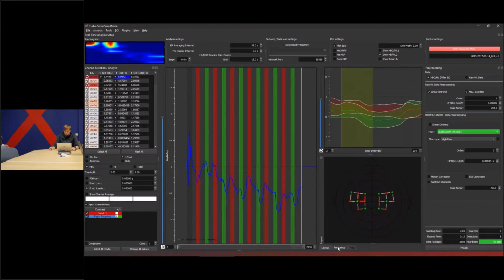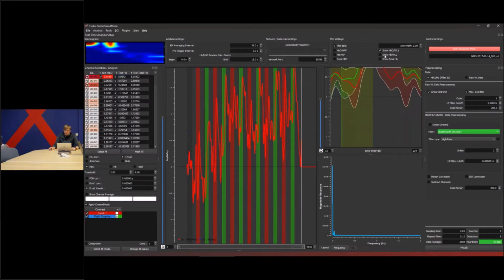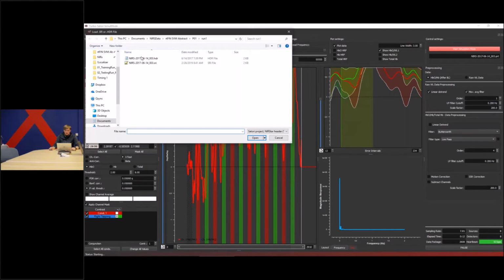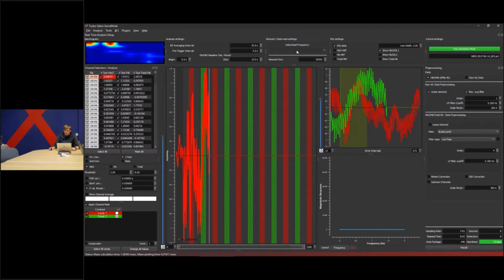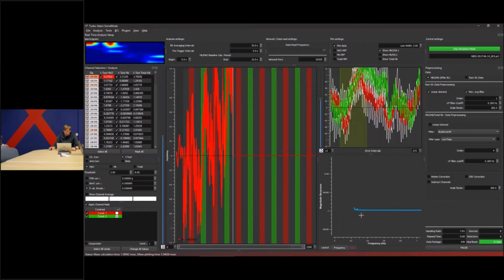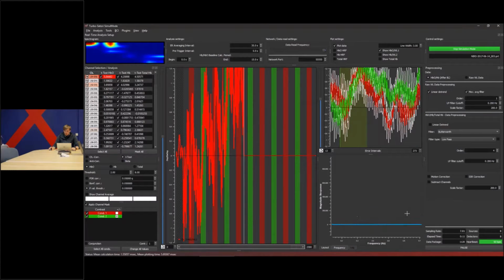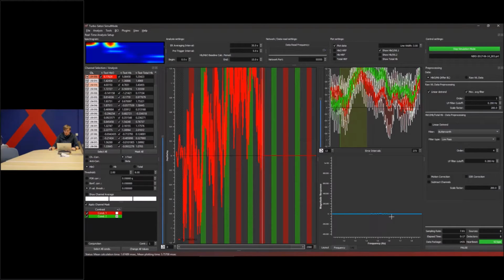If you want to look in more detail at your signal, you can also go to the frequency tab and look at the frequency spectrogram. Here, for example, we see that the majority of the signal is in this part. If we don't run the low pass filtering and then look again at the frequency information, this is also updated in real time. Then we see that there is a clear pattern here, which evolves, and we should also see a heartbeat part, which is visible here in this part of the signal.